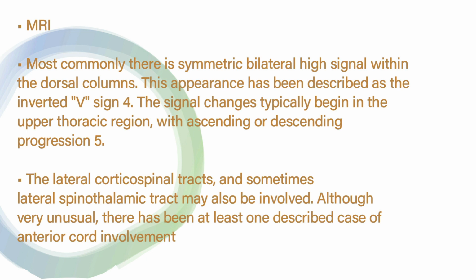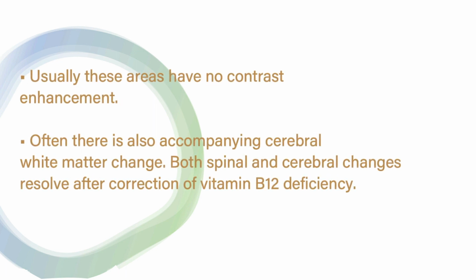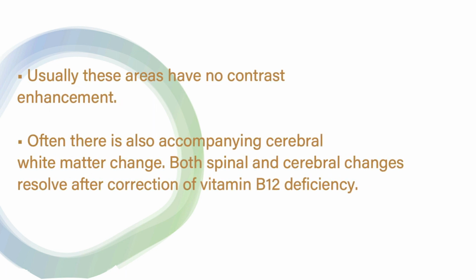The lateral spinothalamic tract can be involved in subacute combined degeneration. Contrast enhancement will not be seen in these cases. Sometimes there can be associated cerebral white matter changes in cases of subacute combined degeneration.